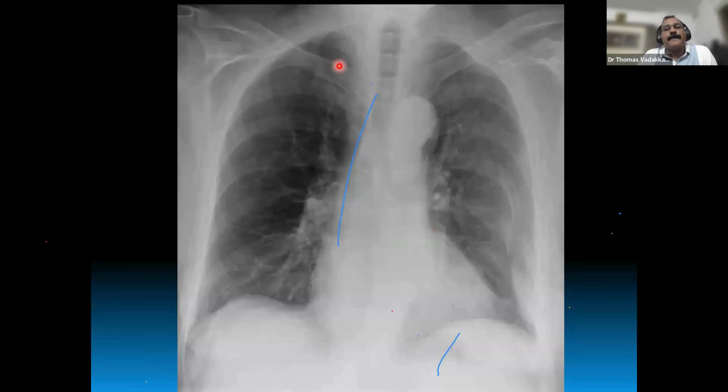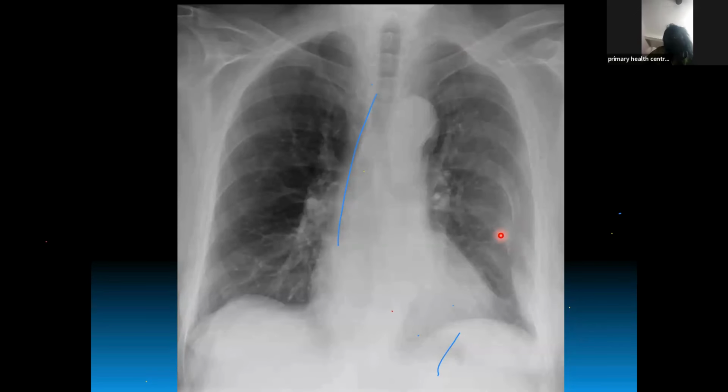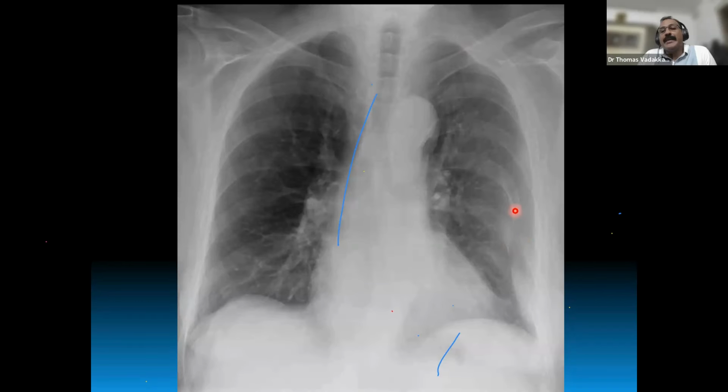This one. Actually, this patient came following a road traffic accident. So you have to see the individual bones one by one. When you trace the bone over here, what is happening? These ribs are not continuous, right? Yeah, there is a break in the rib.